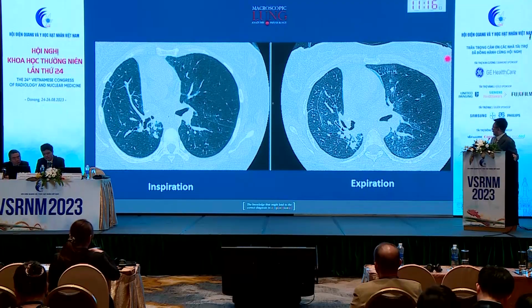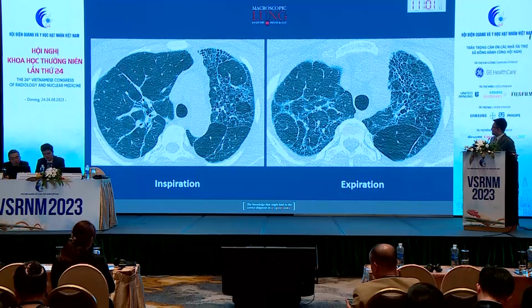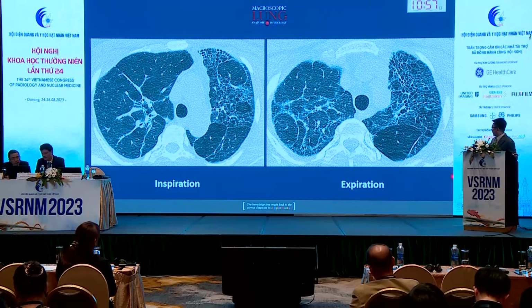And we can see the area of air trapping better if we ask the patient to exhale. For example, this is inhalation. We can observe the area of more hypodensity, but when the patient exhales, we can see it much more clearly. And this is inspiration and expiration. You can see the air trapping very well here.